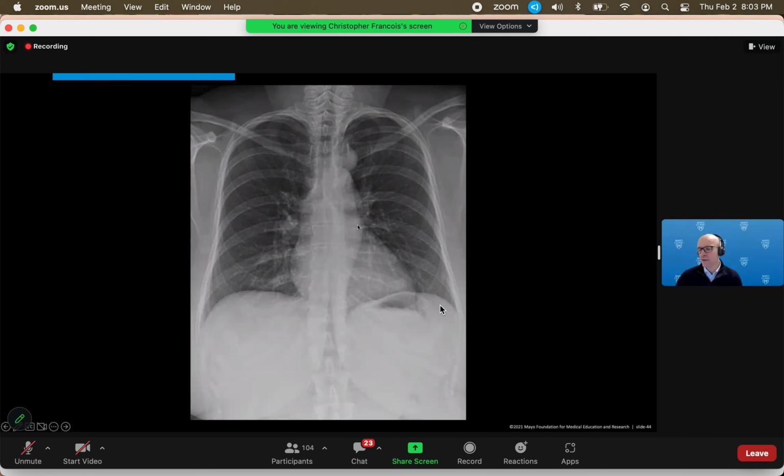Yeah, so if we thought, this is the abnormal opacity. It looks like it's posterior mediastinal. And so, within the posterior mediastinum, we have sort of neurogenic things. So maybe this is a neurogenic tumor. Maybe it's kind of extrapleural or pleural. So maybe like a pleural fibrous tumor.